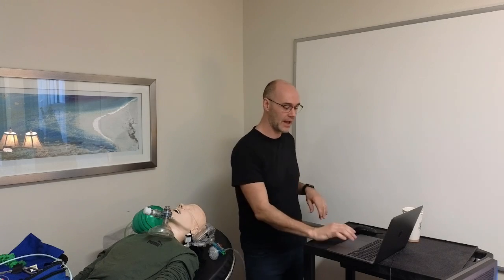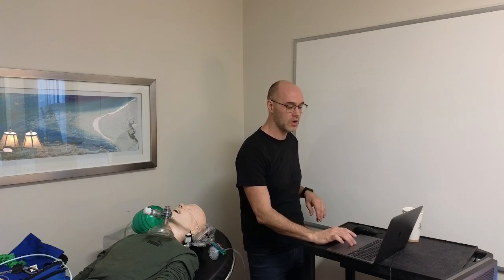In other conditions, it may be considered, but where the overwhelming evidence is, this is good for COPD patients that have escalating end-tidal CO2 and acute decompensated heart failure patients with a good blood pressure. This is where this has been most successful. So I hope that's helpful and brings some clarity around CPAP and PEEP, and then BiPAP and our application and which patients we might treat with that.